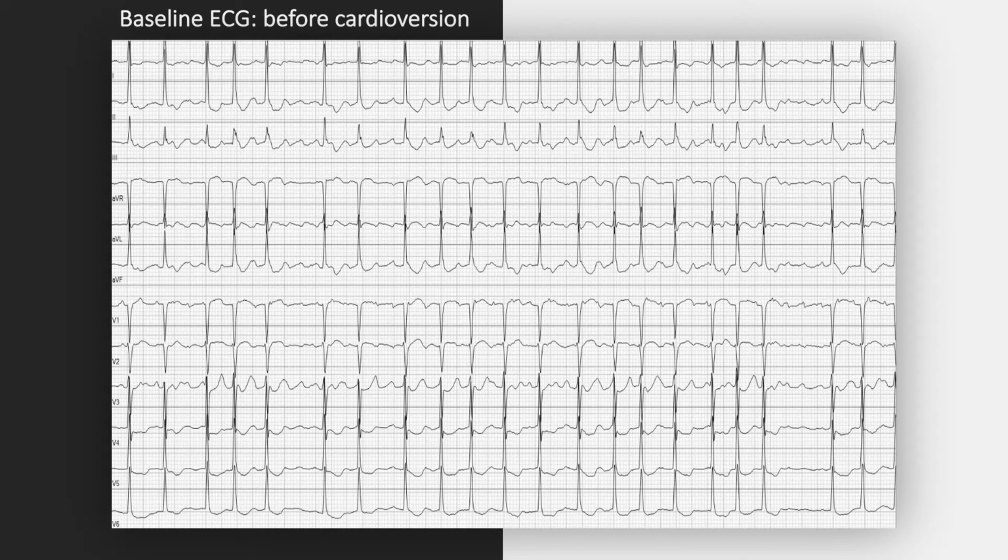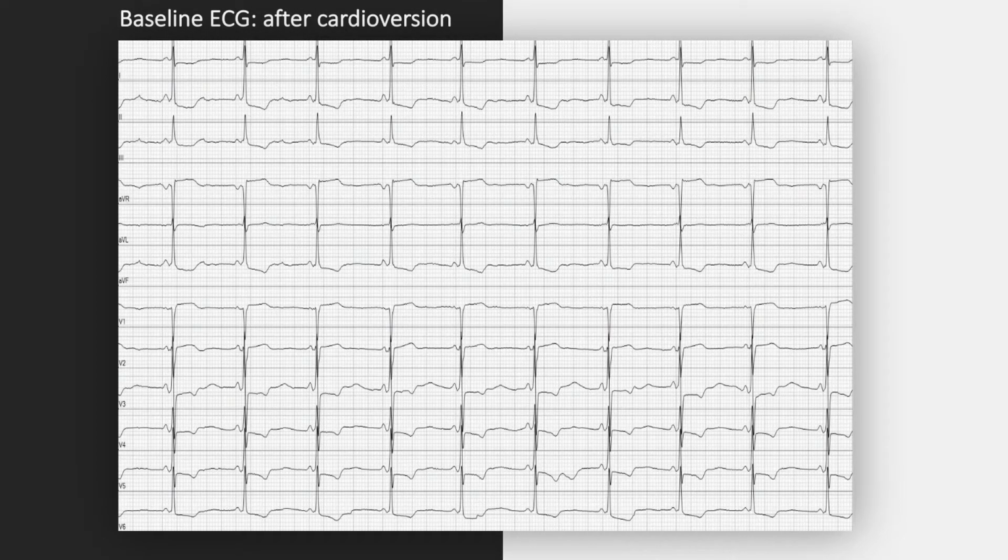In the ECG on admission, we see atrial fibrillation with rapid ventricular response, and in the next slide, we will see the ECG after cardioversion. This patient had a short PR interval, as we see here, in normal sinus rhythm with a small QRS complex. This could be due to supernormal AV conduction, which is assumed to be the underlying cause of LGL syndrome.